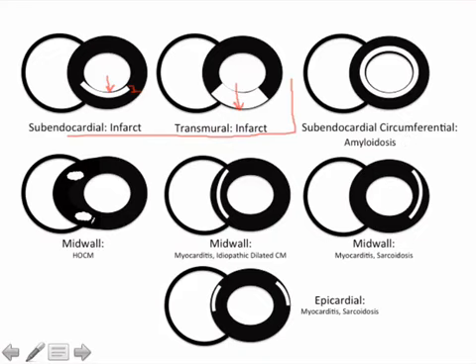Hypertrophic cardiomyopathy will have this patchy sort of cloud-like enhancement. When it does have it, it doesn't have to have it. When it does, it's associated with a poor prognosis. It'll favor the septum. Myocarditis is going to be classically in the middle, look like that, look like an Oreo cookie, and it favors the lateral free wall.